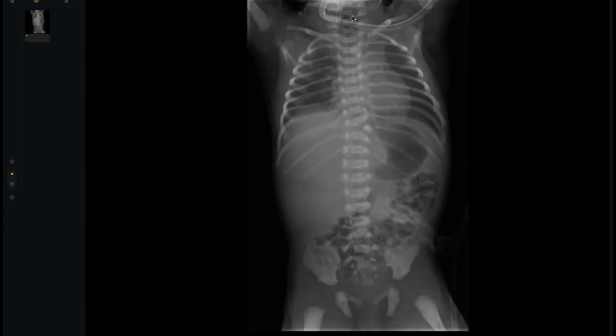It could be the H type or type 5, as I remember. I'm not sure about the number of the type. For each type you must see where the catheter goes down, and it's less common. So I believe that it is the most common, with esophageal atresia and tracheoesophageal fistula in the distal part. So you are telling me there is a distal fistula. Yes. Okay, thank you, doctor, so much.